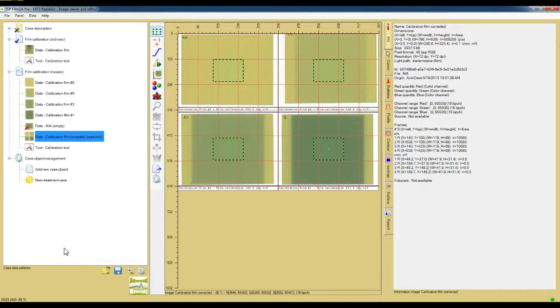The huge files created by scanning at more than 200 dpi resolution can slow calculations to a crawl, and are usually unnecessary since most treatment plans are at 1 millimeter resolution or less. If a high resolution image is needed, then limit the scan area as much as possible to keep the file size in bounds.